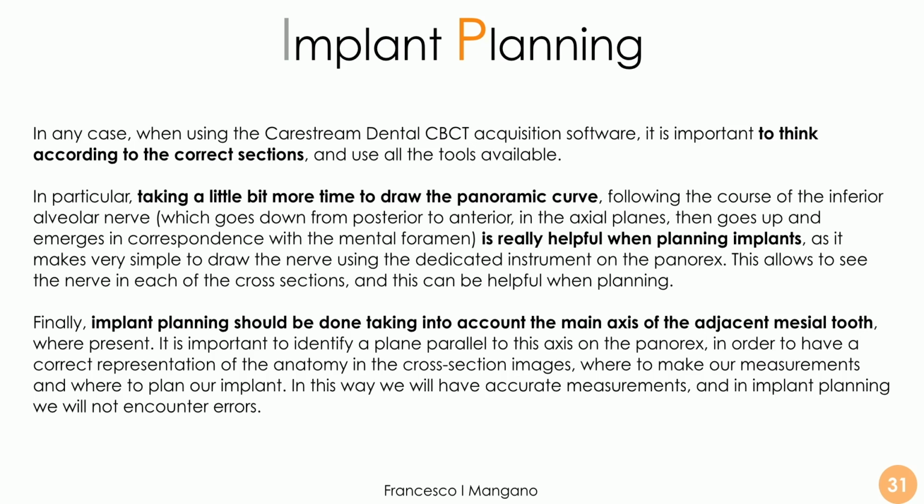One is take a little bit more time to draw the panoramic curve, because if you can do it, as I told you, following a little bit the path of the inferior alveolar nerve, for example, in the case of the mandible, then you save a lot of time when you have to draw the inferior alveolar nerve. You can draw it directly in the panorex, and it's a good advantage because you don't have to correct it too much, and you find it automatically drawn in each of the cross sections. So very important how to use the panorex well.